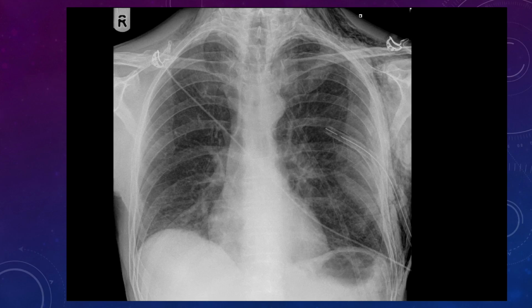Okay, so again, thinking about the surgical emphysema, we have to check the side hole positions. I've got a lovely case later to show you where you have to appreciate the side hole positions in the chest drain. Okay, you might vent the air out from the pneumothorax, but you've got to make sure that you've got your chest drain in the right position. So it's appreciating that.